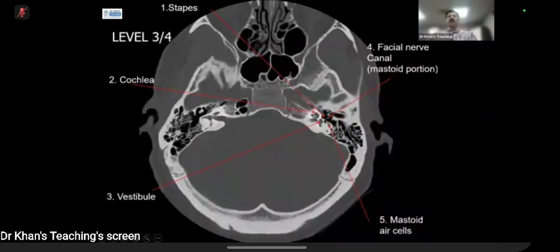I think this is a bit harsh for the simple reason that I can understand it is not projecting very well for you, stapes, and the arrow is slightly off. So it's a bit harsh. So I think I'll disregard that. The point was that the stapes is visible here. And this flower, of course, is cochlea. This thing is the vestibule.